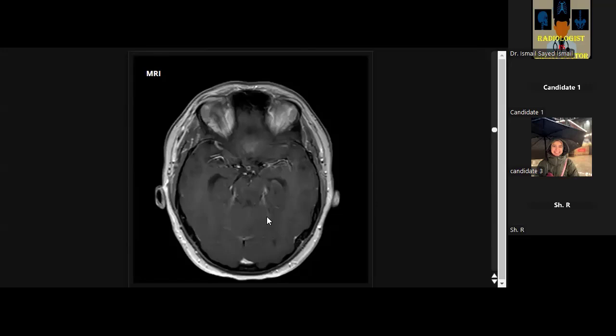Good, good. Choroid plexus papilloma is also one of the very good differential diagnoses, especially in adult patients affecting the fourth ventricle. Very good. Accepted, two routine differentials. It's a case of choroid plexus papilloma in an adult patient. Choroid plexus papilloma can occur in the fourth ventricle.